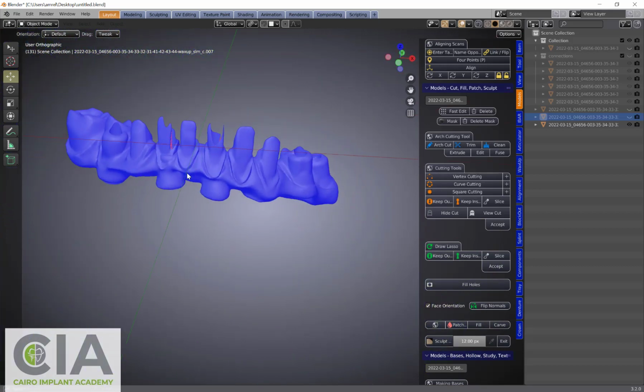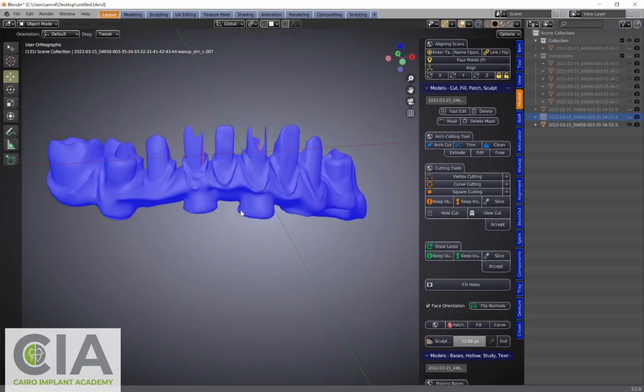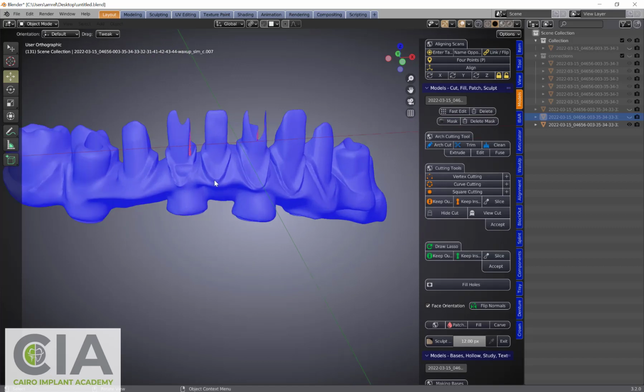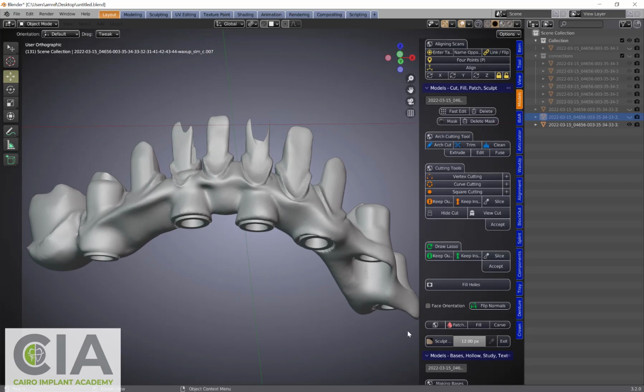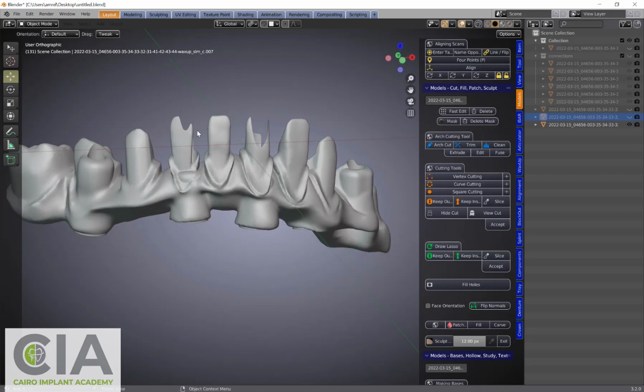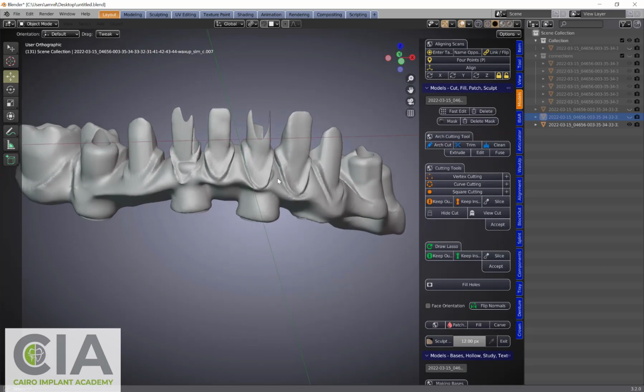The problem is that the guys who did this don't want to go through the redesigning procedure once more, and we want to make this a millable part by using Blender software. So the first step is that I would like to separate the connections, do some corrections in the structures here, and then reunite the connection with the framework once more.